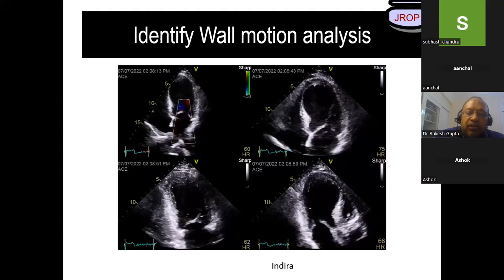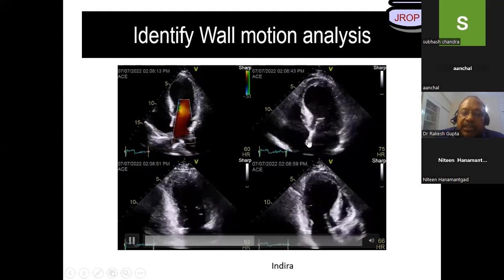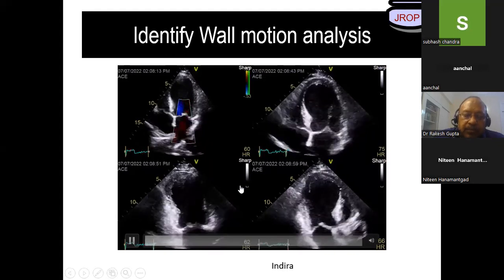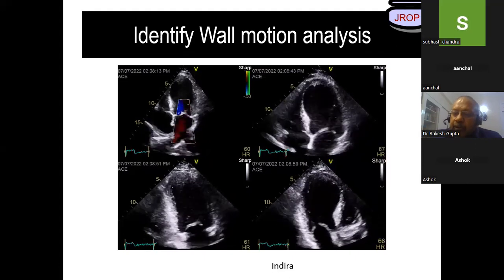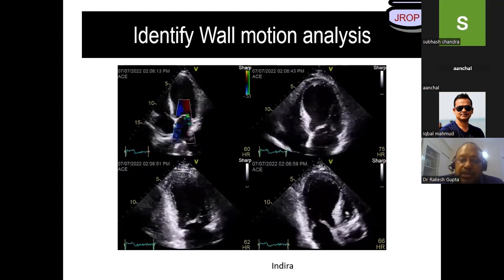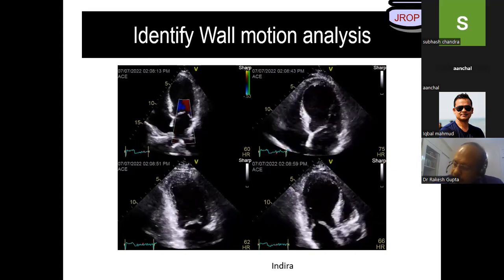So looking at all views, where do you classify this abnormality? RCA, LAD, or circumflex? LAD, sir. Perfect, LAD. Now my next question, Ashok, to you is, is this an old infarct or a new infarct? If it is old, why? New, why?